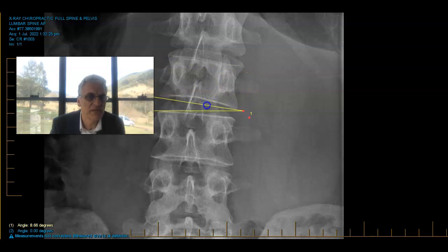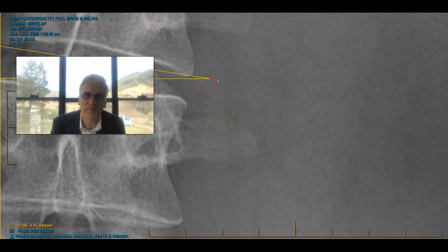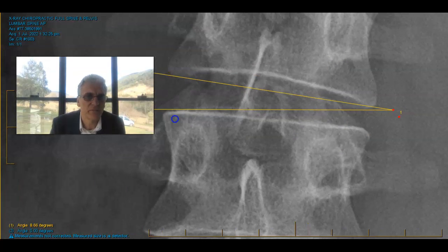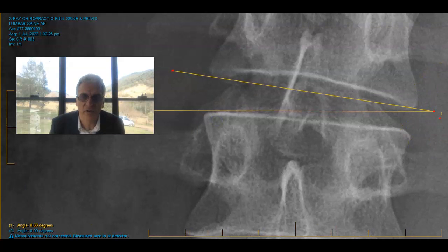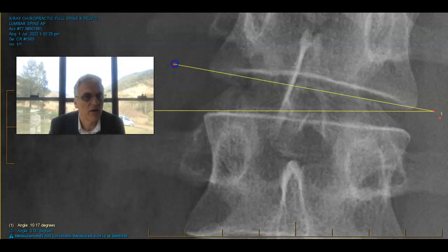So I'm just coming down there, and again I'll enlarge it so that we can see what I'm doing. But notice how you've actually got to go from the tip of that rounded section of the vertebra there to just there.